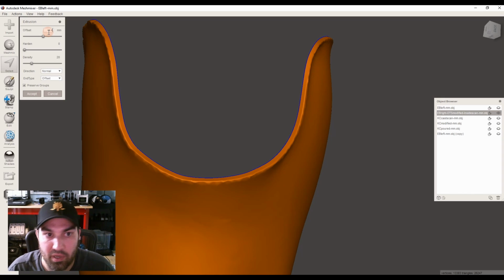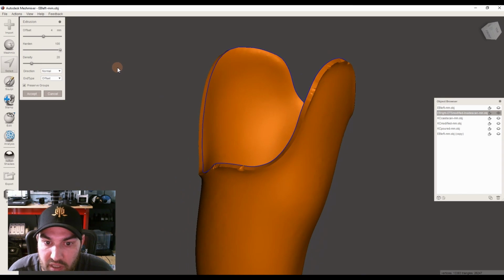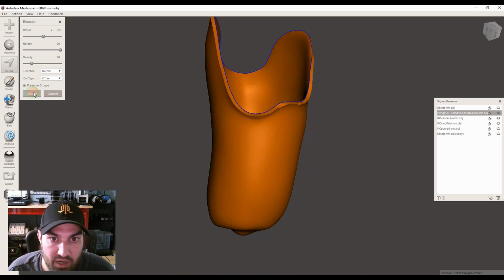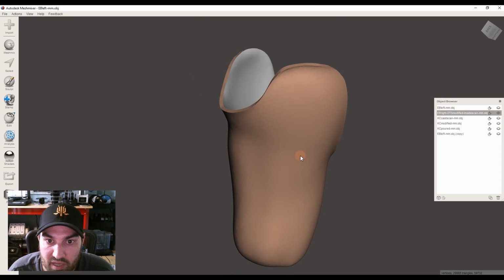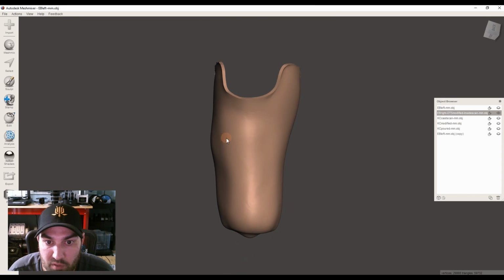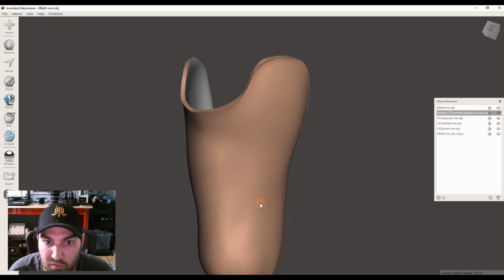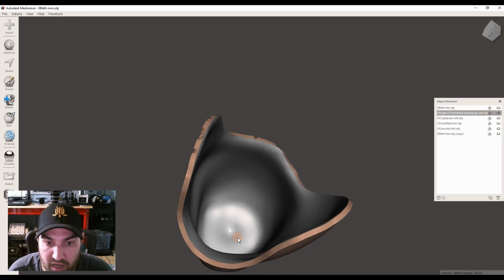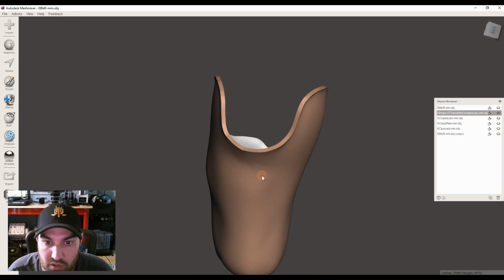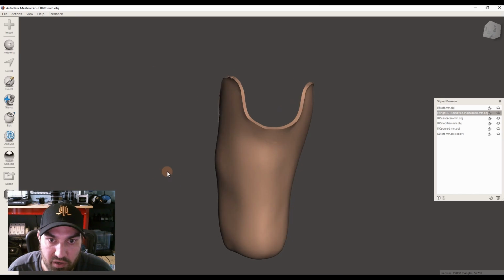So let's say we want to make a 4mm socket, harden our edge, and that would actually give us now a socket that would be a printable file as it is. So say that could be maybe a 4mm thick inner flexible, and then you could build a frame over that, and that all came from your inner surface that you scanned from your test socket. So that should be a direct swap from test socket to flexible and definitive.